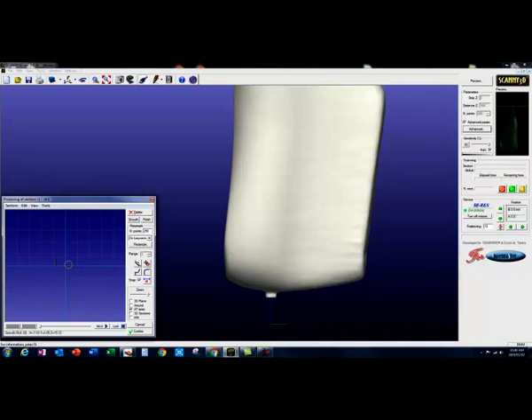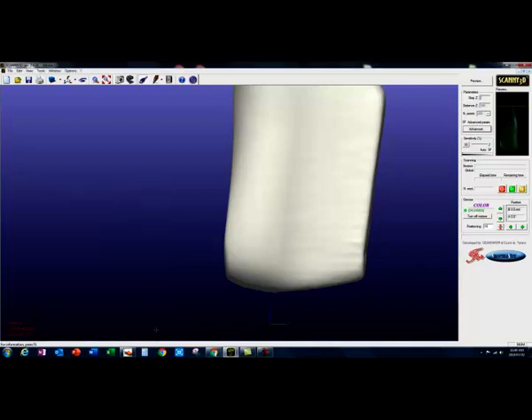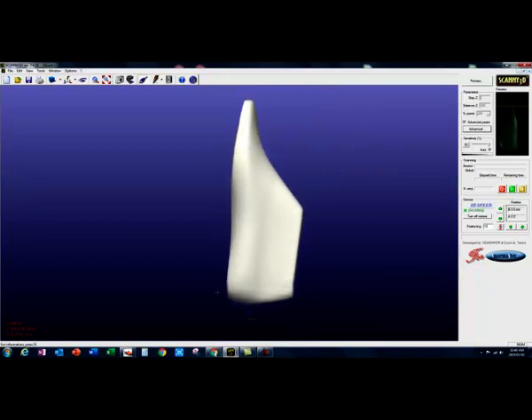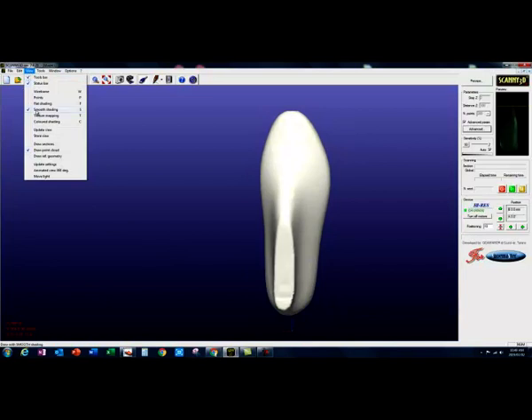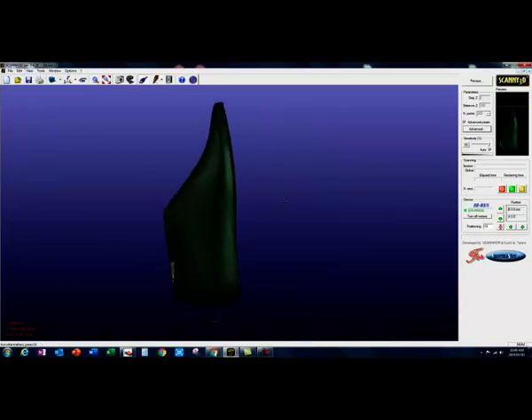Okay? So, I want to delete this one. Yes. I can see there's still, you don't see anything at the moment. Delete one more. Yes. I think I can delete another one. Yes. Okay, that's where I want to be, as soon as I start seeing that. And here I will say confirm. And then you see that's gone there. I chopped that piece off. So we're happy with everything here now. I'll go back in my view to the texture mapping so we can see this.